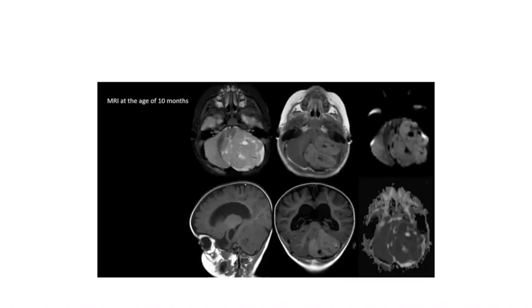So this is the MRI at 10 months of age. So now the left cerebellar hemisphere, which was dysplastic, is completely replaced by a heterogeneous enhancing lesion, which is also quite cellular, as evidenced by this diffusion, and shows this brain within brain kind of appearance. And as expected, this was a medulloblastoma of extreme nodularity, which we know is always SHH driven. So what is the connection?